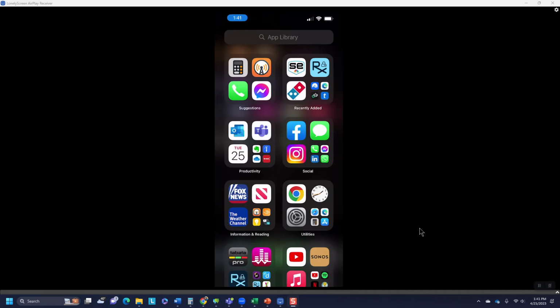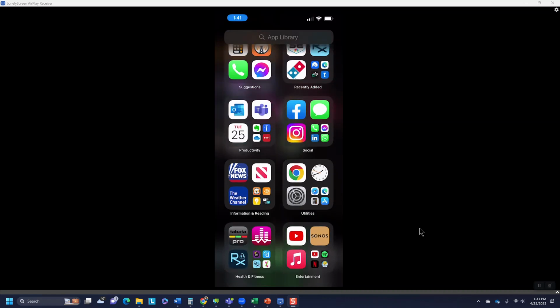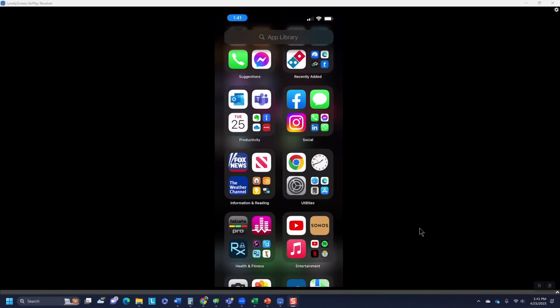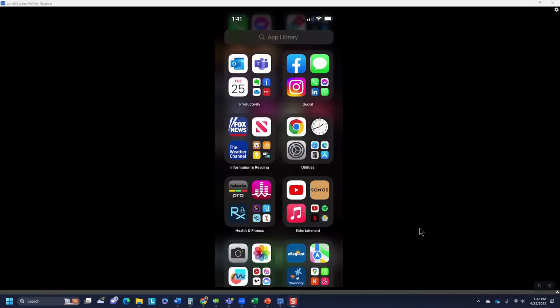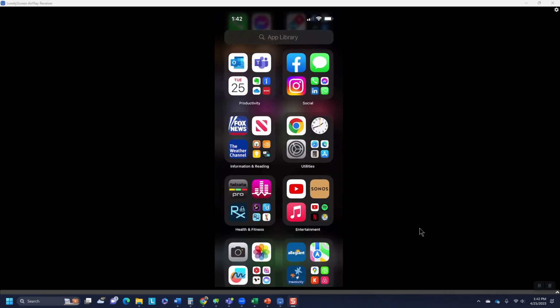All right, I want to give you a quick demonstration of how easy the MovementRX home exercise program that allows for remote therapeutic monitoring is. So this is the design. This is actually a screenshot of my phone. We're going to open up the MovementRX app.